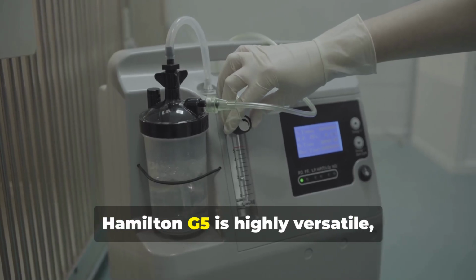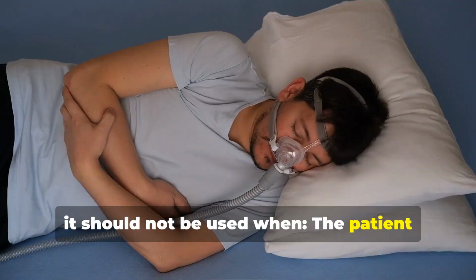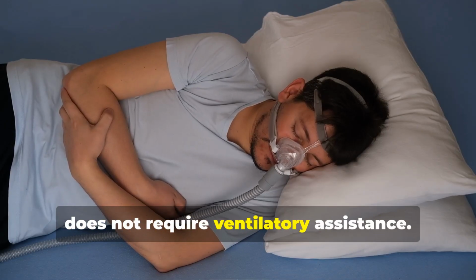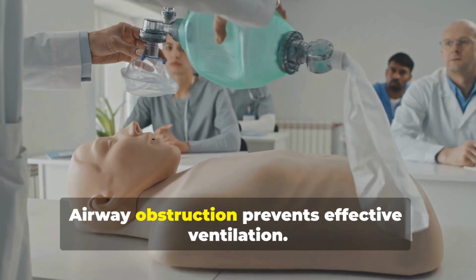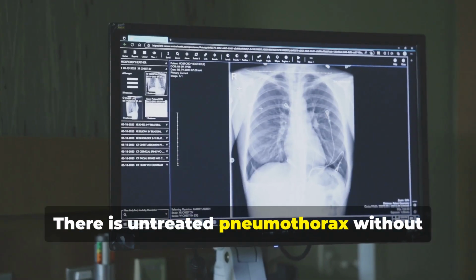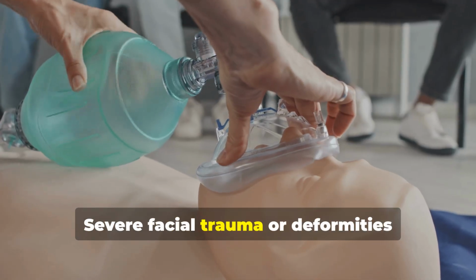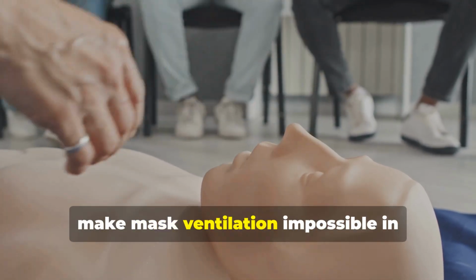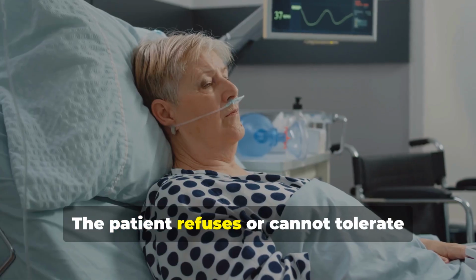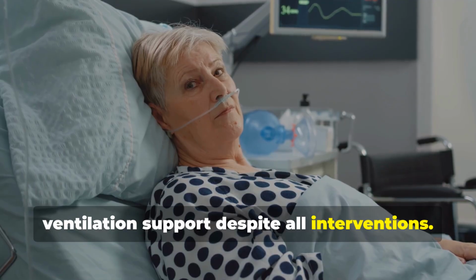Although the Hamilton G5 is highly versatile, it should not be used when the patient has adequate spontaneous breathing and does not require ventilatory assistance. Airway obstruction prevents effective ventilation. There is untreated pneumothorax without a chest tube in place. Severe facial trauma or deformities make mask ventilation impossible in non-invasive mode. The patient refuses or cannot tolerate ventilation support despite all interventions.